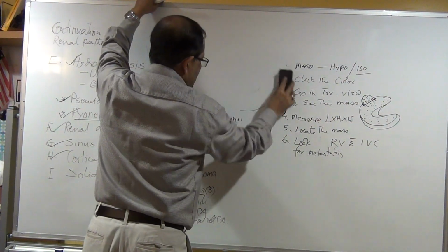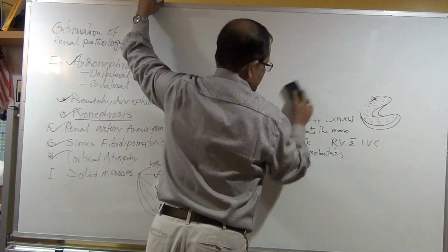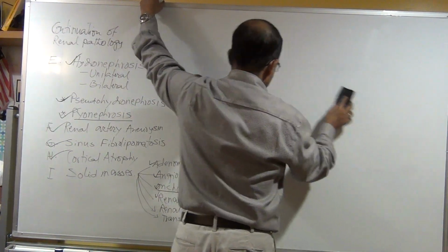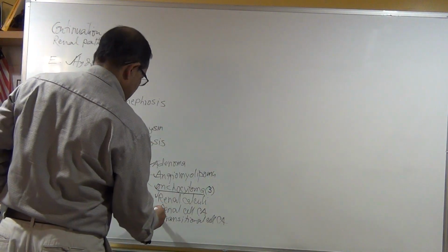There are a lot of times you can miss it because of its echogenicity. It is in the cortical region, the cortex is darker, and the tumor is also darker, iso- or hypoechoic. So now we'll discuss the transitional cell carcinoma.